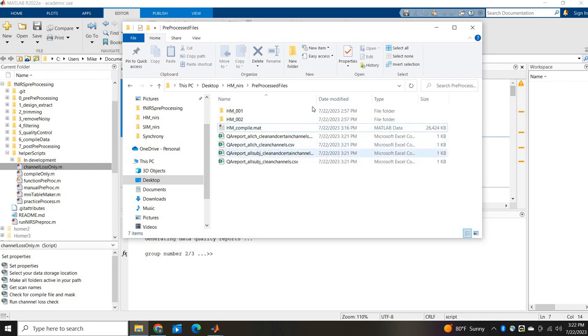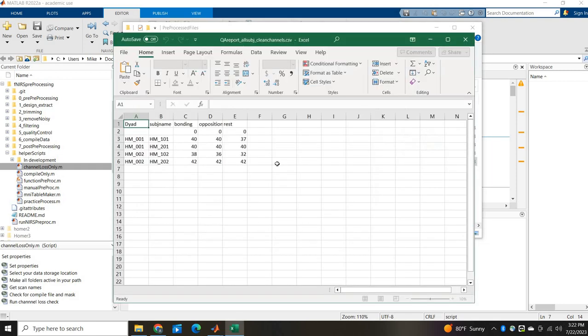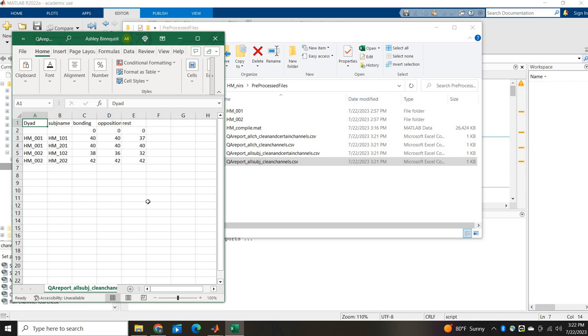Alright, so I have these 4 CSVs that I just made. What it's doing is giving me the noisy channel rejection as well as the noisy and uncertain. No need to do no rejection, as that would just be all channels. So if I open up all subjects, clean channels, we're going to see for my dyads and my subjects, as well as my scans, how many channels I still have. So instead of how many did you lose, it's telling you how many you still have.